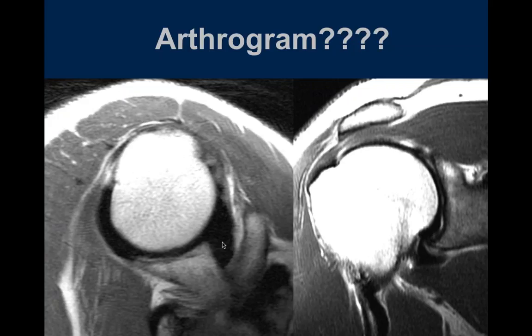If you have a tear, this is an arthrogram injection. I know what this is. If it's an arthrogram, I'm wondering about the concentration. Is it possible that the concentration may be a little bit too much? This was too concentrated. The person who did the injection didn't dilute the contrast adequately. I think this was a 2-to-1 dilution when it should be a 200-to-1 dilution.